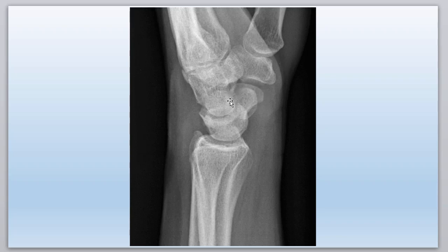And the waist of it would be here, and it goes down. And it superimposes the Pac-Man right here. See that superimposition? I drew this for you over here. And there's the waist of the scaphoid, which is commonly fractured. Remember we said in the lab it's a bad thing to get a scaphoid fracture.